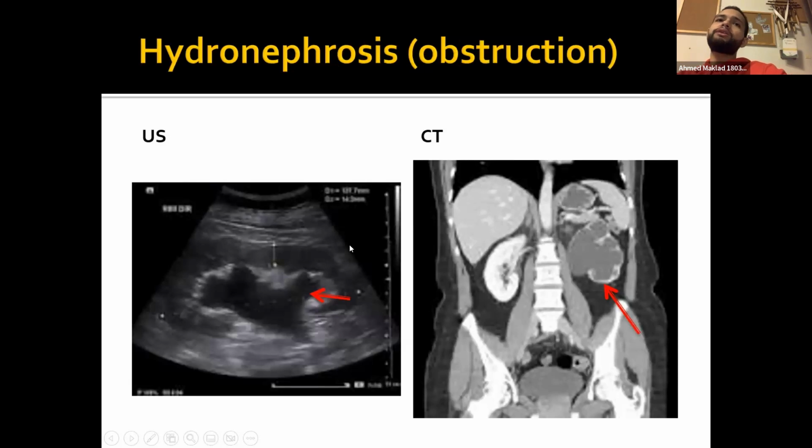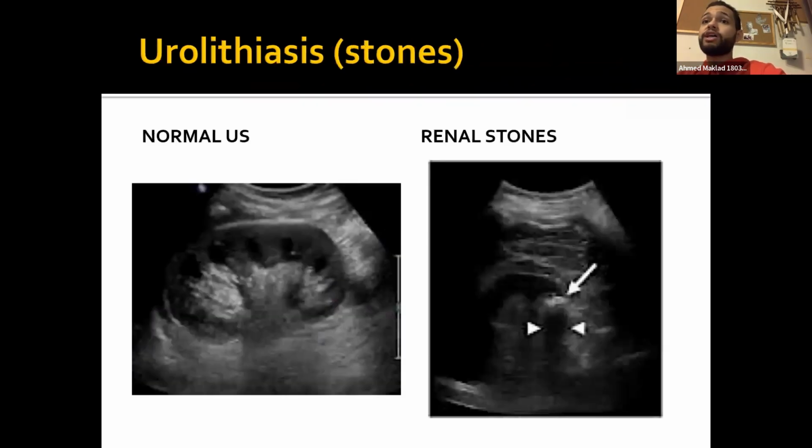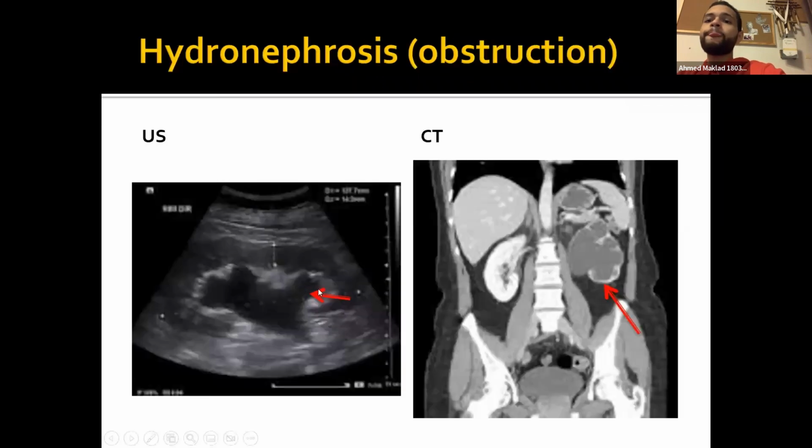This is a case of hydronephrosis. Guys, what is hydronephrosis? Kidney big, basically, yeah. Yeah, sorry, I mean a shadow. There's a posterior shadow. Now, you know how the kidney is connected to a ureter, right? If the ureter is blocked and the urine starts backing up into the kidney, the kidney becomes dilated. Okay, and that's what you see.